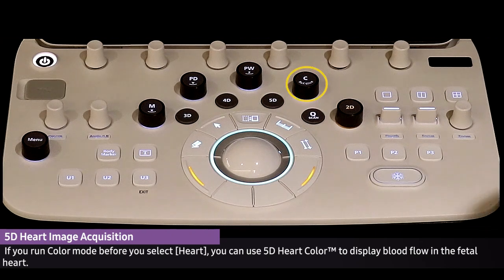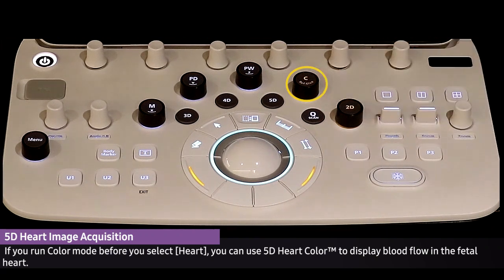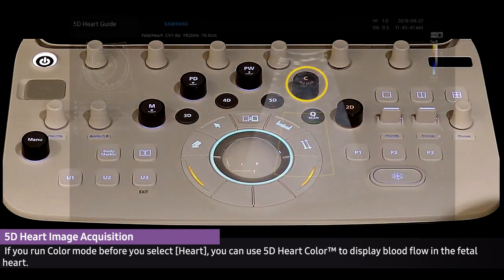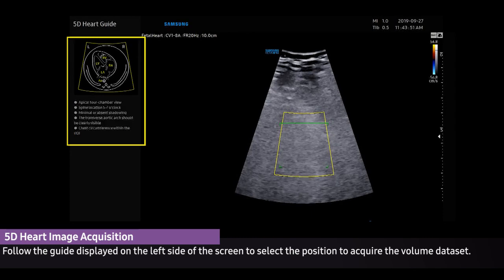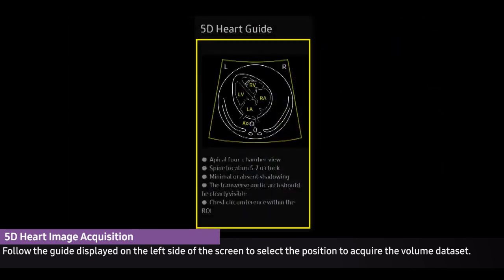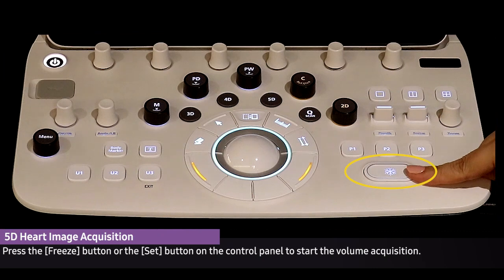If you run color mode before you select Heart, you can use 5D Heart Color to display blood flow in the fetal heart. Follow the guide displayed on the left side of the screen to select the position to acquire the volume dataset. Press the Freeze button or the Set button on the control panel to start the volume acquisition.